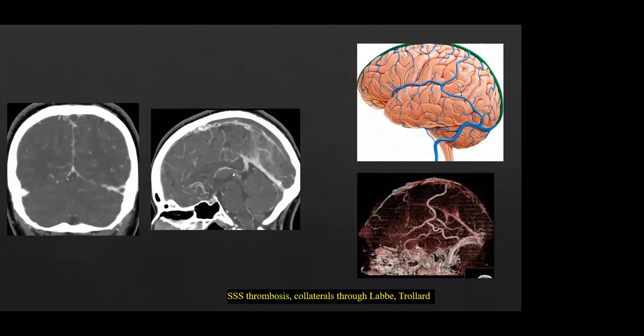This is again another example of venous sinus thrombosis, to understand the clot within the sinus itself, and the enhancement is the normal enhancement of the dural leaflets. So the dura will enhance normally. As you can see here, this is how the enhancement should be when the blood is flowing through the sinus. There is no blood flowing through the sinus, but this is enhancement on the walls of the sinus itself.